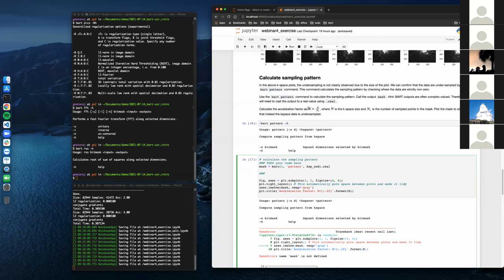Natalie, you're on a roll if you'd like to continue. No, sorry, I don't know. All right, it's all right. I'll just fill it in because it's not a BART command, at least I'm not aware of a BART command that does this given a mask.